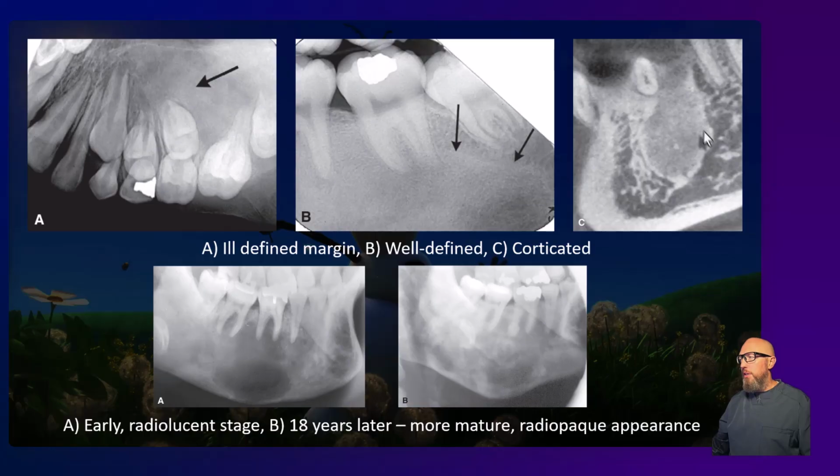I think most of the literature I've read on these type of lesions would consider that more just the idiopathic osteosclerosis. But there are lytic variants as well. As you see this, it almost looks like an ill-defined lytic lesion. But most ill-defined lytic lesions, you're thinking like malignancy, they don't cause expansion of the bone like that. And so that's kind of a unique thing about this appearance.